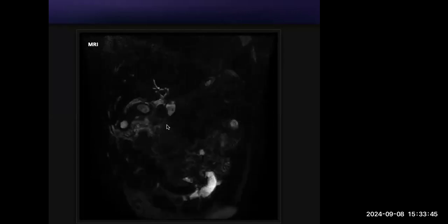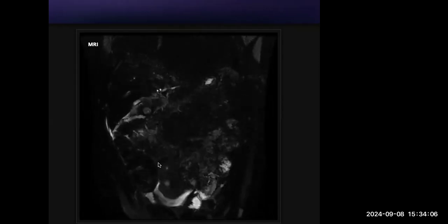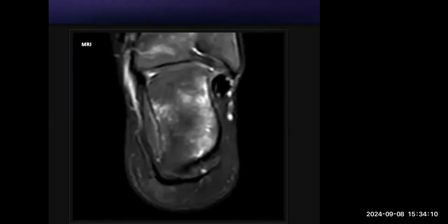The moment you said smooth tapering, you should have excluded malignancy. That's the difference between a benign versus malignant structure. There is no shouldering, and no irregularity along the margins. So this was a case of a stone compressing over the CBD. Do you know the name of the syndrome? Mirizzi syndrome. Yes, this was a case of Mirizzi syndrome.